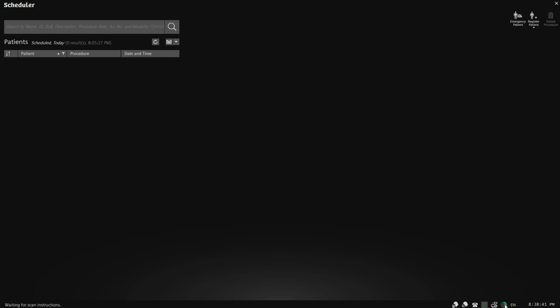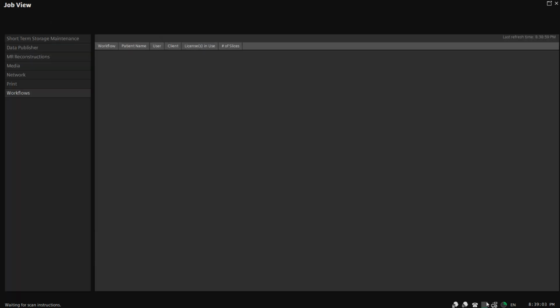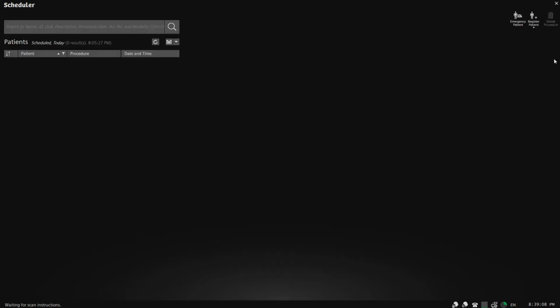So first we have a little pie chart with disk space. So the more green you see in this pie chart, the more data on the hard drive. This green bar, or this little green line, this is the server load. So our understanding of this is how hard the system, the computer is working, the actual tower. And apologies, let's go back.